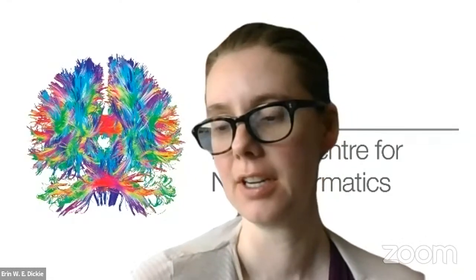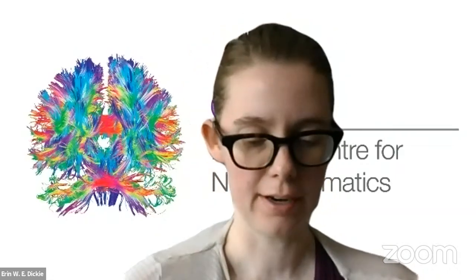We're going to start just by going back to that idea of BIDS conversion. I said yesterday that BIDS conversion is meant to be so simple that you don't actually need scripting to be able to do it. So I'm going to walk through the first tutorial walkthrough that exists in the BIDS Starter Kit, just to show how BIDS conversion could happen without scripting. This tutorial is entirely available online for you to scroll through if you prefer. Wait, I'm going to share my screen first.